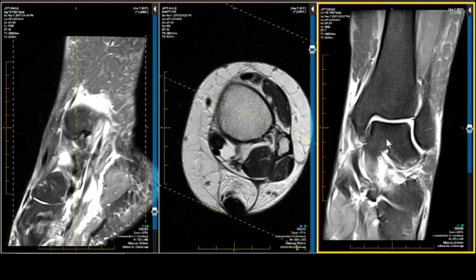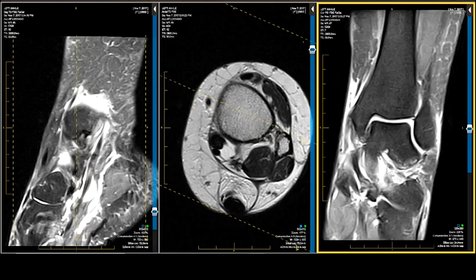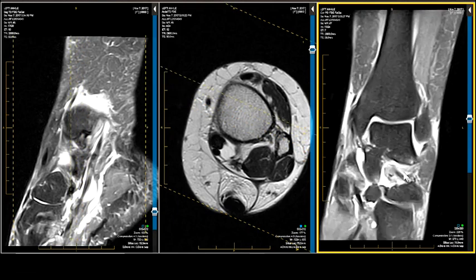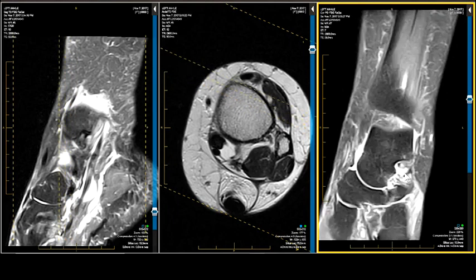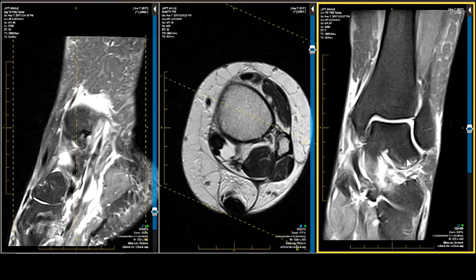The subtalar space looks terrible. Wow. And you know why it looks terrible? It's dysplastic. There's the talocalcaneal IOL. And then it just dives into some awful-looking tissue. That's the cervical ligament right there. This is all inflammatory tissue, but not primary synovitis. The lateral retinaculum is very irregular. And with all this inflammation, it is likely that this patient has sinus tarsi syndrome from dysplasia.